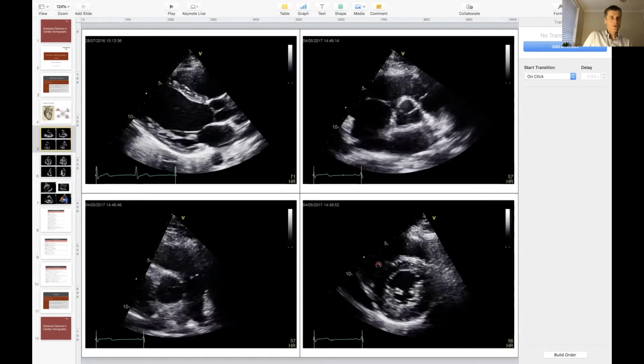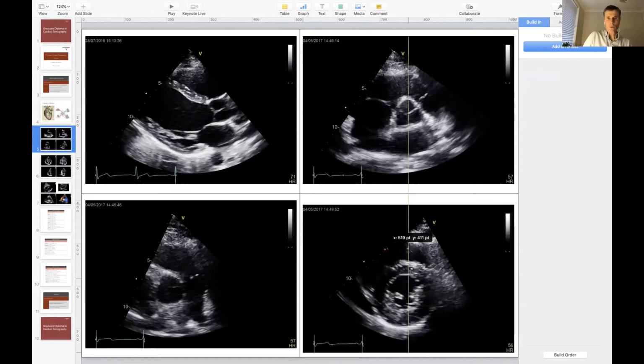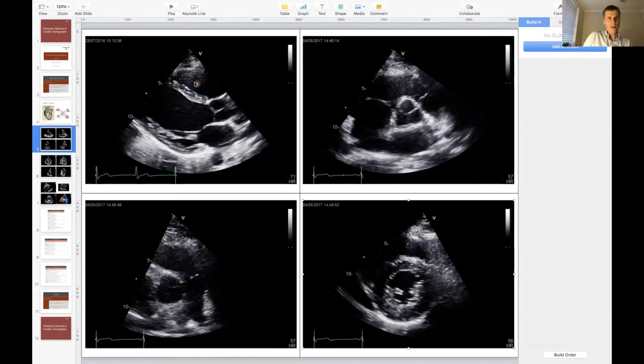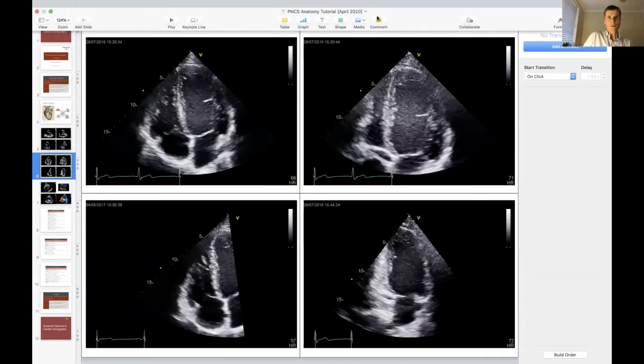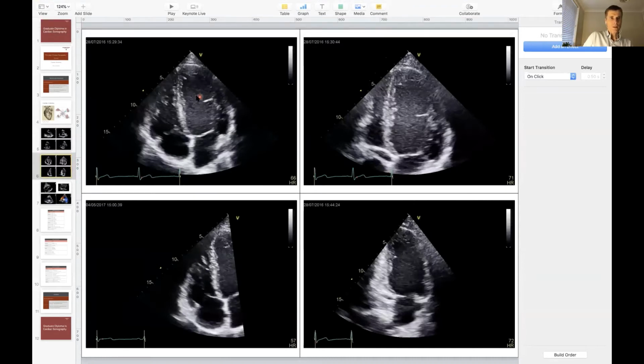The right ventricle has what's oftentimes termed a free wall, and the free wall of the right ventricle is seen there, and you can see part of it in that top image too. What we can't see on that particular image is the moderator band, but hopefully we can see it in one of the other ones here. You'll notice that there's a structure about two thirds of the way towards the apex. It goes across here, and it's the moderator band, and that's the passage of important electrical fibers within it. The right ventricular outflow tract I pointed out to you earlier as well.